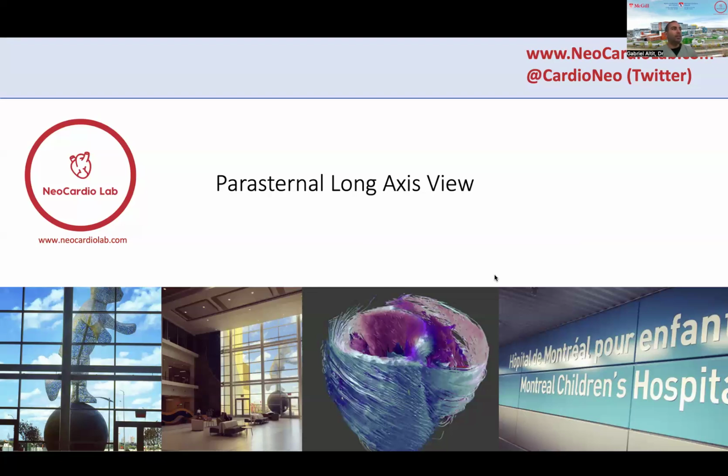And pulmonary veins, even if you look at them structurally on the first echo, are something that you always want to recheck in all of our patients, especially the preterms, because there's this entity of acquired pulmonary venous disease that they can have. And a lot of the scans that you may do in your population might be screening for BPD pulmonary hypertension, and it's something you want to check for.